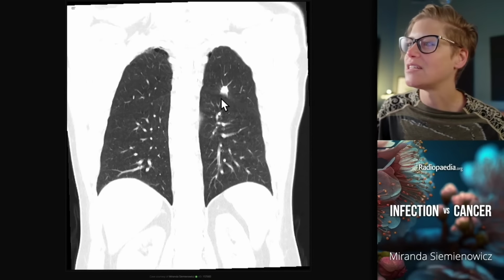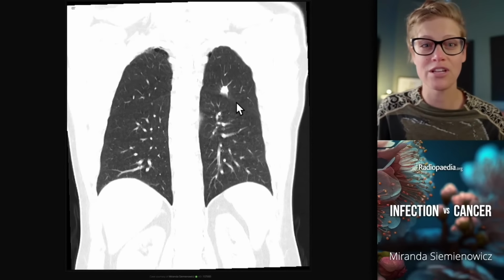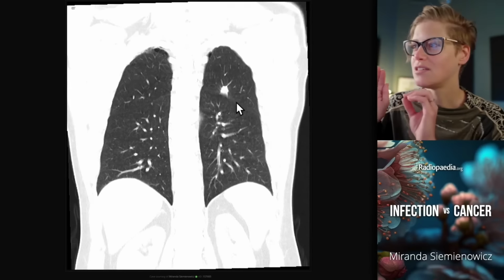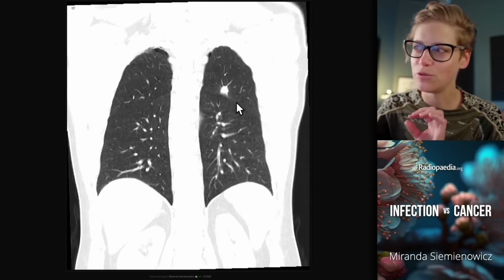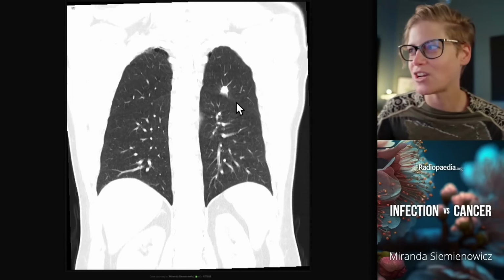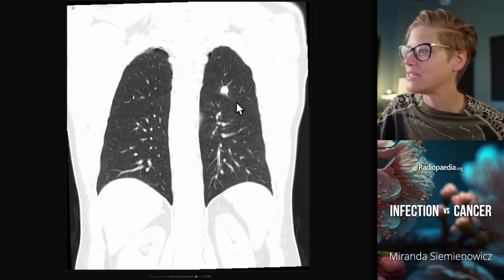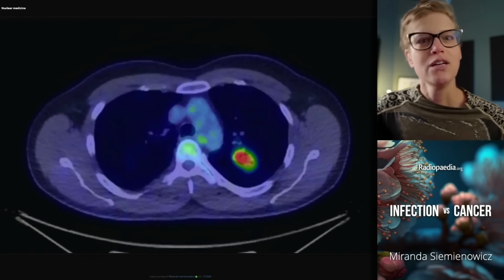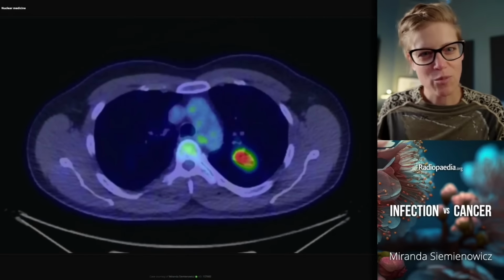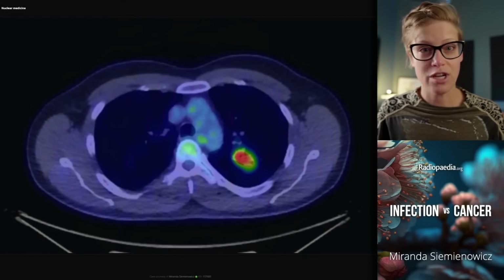And you can see a single secondary pulmonary lobule completely outlined by consolidation. The lung parenchyma architecture is respected. This is a beautiful, normal appearance of lung architecture. The lung is in charge. This must be infection. Anyway, somebody got upset. They've done a PET, which doesn't help because infection is a highly metabolically active process. So is high-grade malignancy, and this is not going to differentiate between the two.